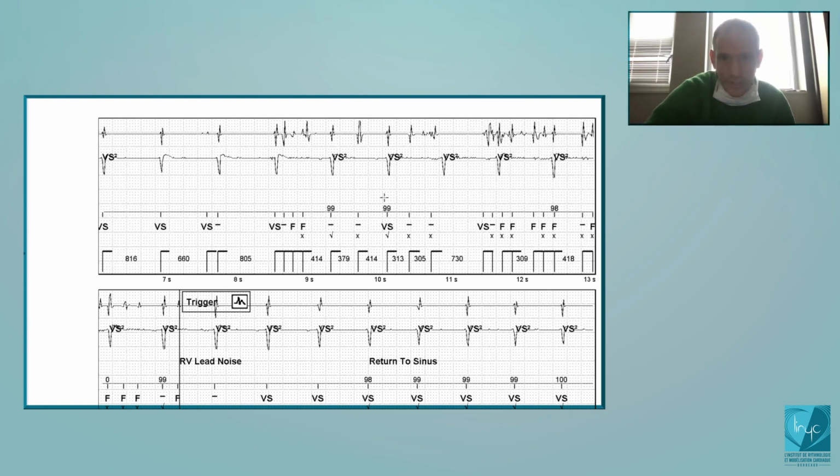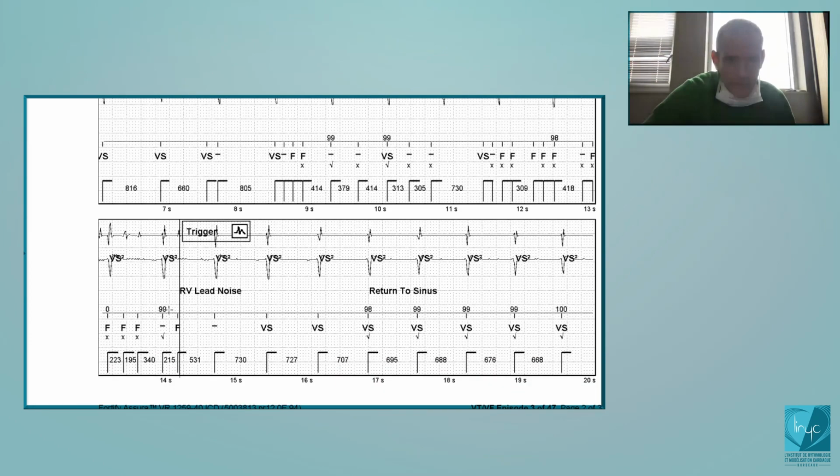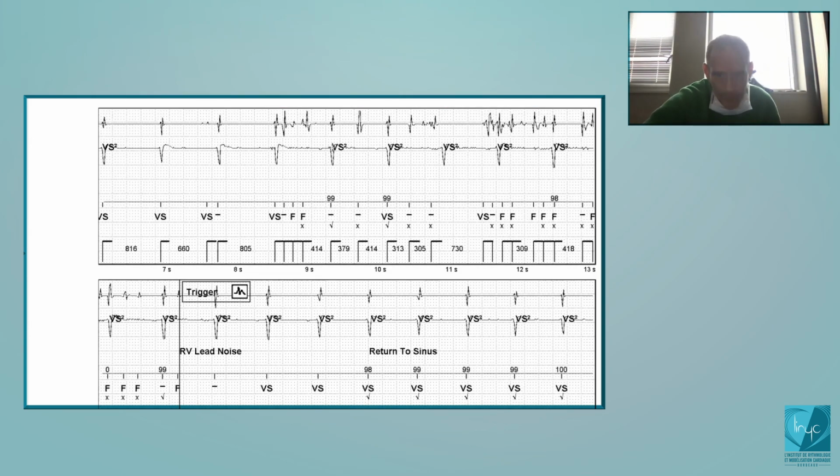Okay, so anytime you're going to have a fast cycle, you will implement systematically the noise counter. It's going to be 1, 2. This one is short also, 3, 4, 5, 6, 7, 8, 9, 10, 11, 12, 13, 14. Okay, so let's consider you are at 16 here, and you never reset to 0 because there is no fast cycle on the discrimination channel.